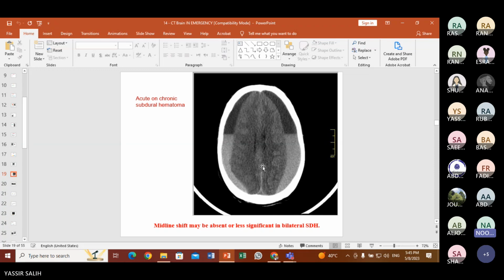There is hypodense and hyperdense. Hypodense, dark in the upper part of the image. It indicates chronic subdural hematoma because it is concave. And from the back, it is hyperdense, whiter, and it is concave, so it is acute subdural hematoma from the back. Thank you. Excellent.